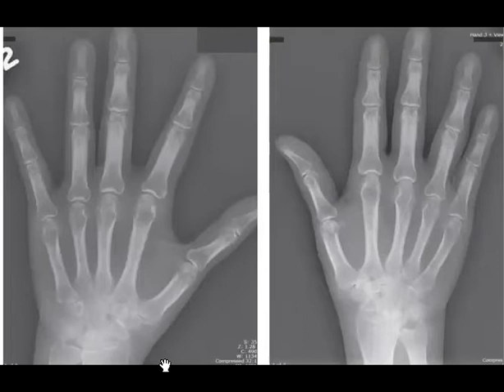So rheumatoid arthritis can involve the synovial joints in a symmetrical fashion, right? And you will search for osteopenia and erosion if you find any erosive changes. The characteristics, you can find something like subluxation, right? Joint space loss, as here, and you will search for any soft tissue swellings, right? So for psoriasis, we will search for periostitis and new bone formation. I agree with you. Perfect.